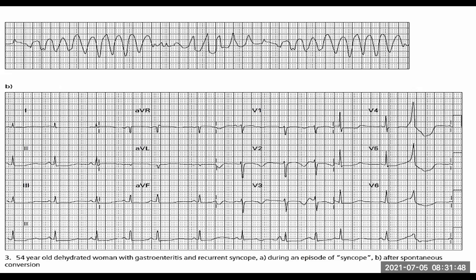The rate that we're looking at, we have to look at the fastest rate. So you take the 2 closest PQRS or QRS complexes, right? So it's about 1, 2, 3, 3.5, in about 90 beats per minute. So that's relatively normal, okay? Now, let's look at the zones quickly, then we'll go back to the lady and we'll have a look at what's the story.